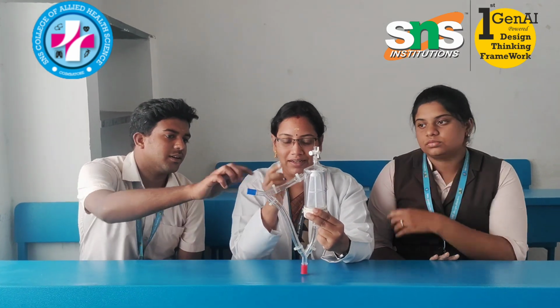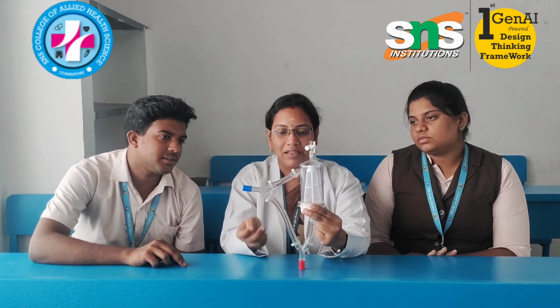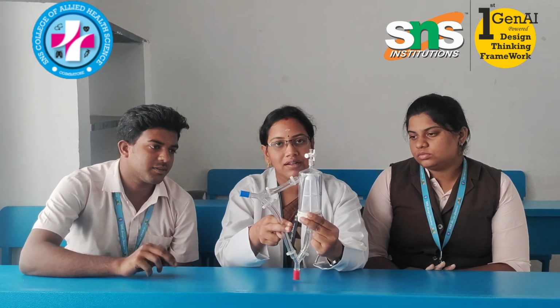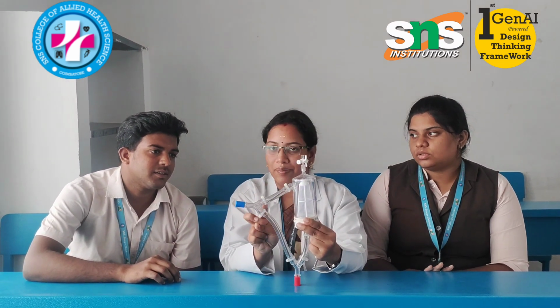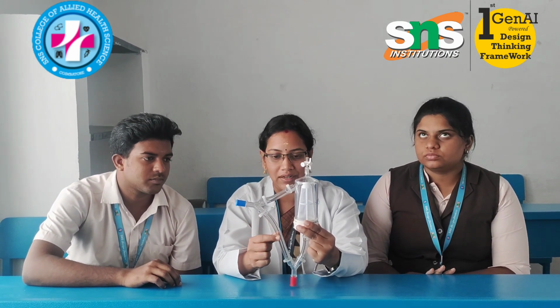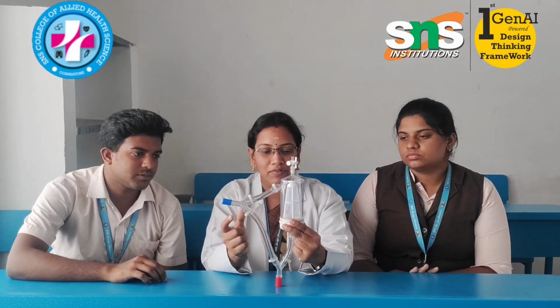Which line is not primed till now? The inlet line. Next I will remove the clamp from the inlet line and place the clamp on the bypass line, because the bypass line is already filled with fluid. Automatically the flow will start reaching through the inlet line, so the inlet line will also get primed. While doing this, the flow rate I keep on the pump is 100 to 200 ml per minute. Only a minimal flow rate is required to prime this entire circuit.